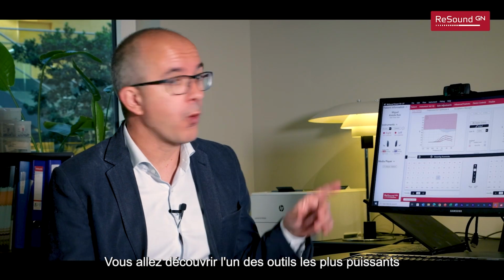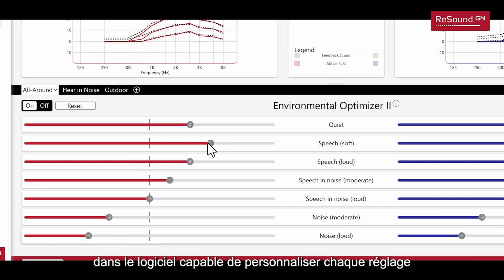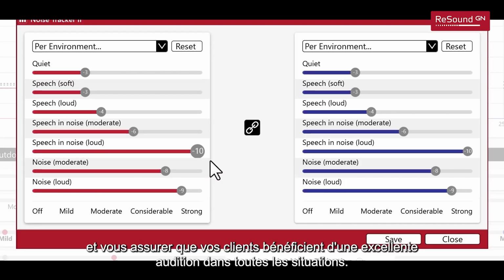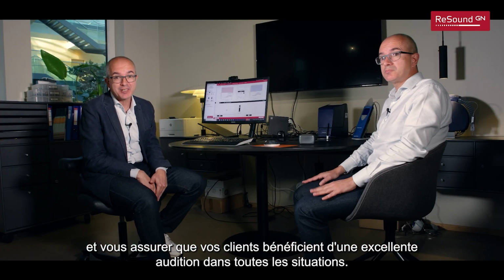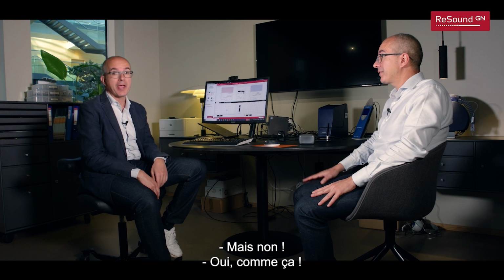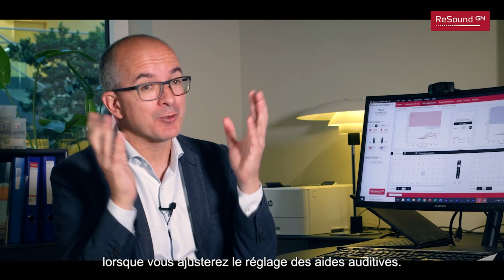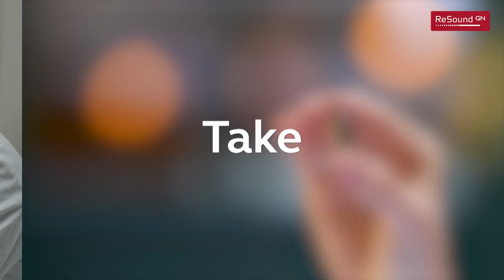You are going to learn one of the most powerful tools in the fitting software to personalize every fitting and make sure that your clients enjoy great hearing in every situation. No way! Yeah way! This is the Environmental Optimizer, a tool that will save you lots of time and frustration when trying to fine-tune the hearing aids.